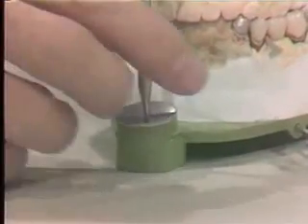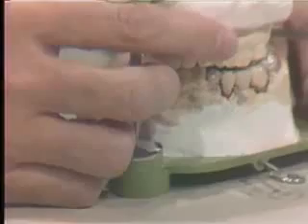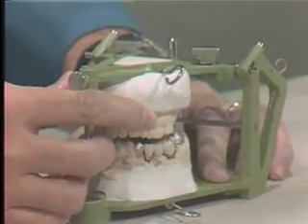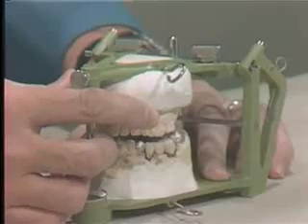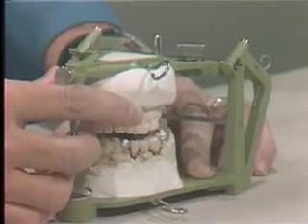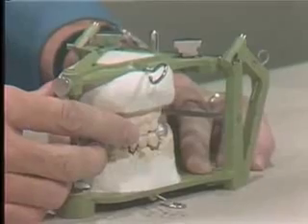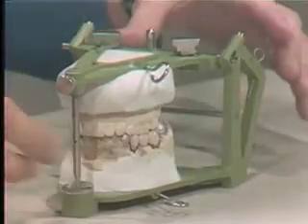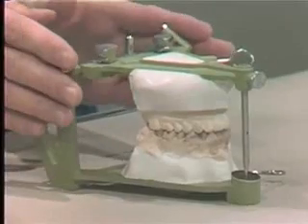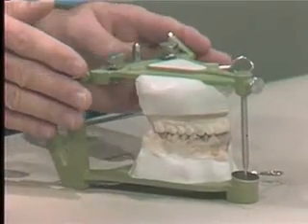These are all averages. They're all set on the articulator. You have some protrusive movement, which means the upper member of the articulator is going to go in a retrusive or posterior direction. But again, this is a set movement. You can't change it on this articulator. And the only advantage perhaps to this articulator is that it more nearly matches the size relationship to the skull.